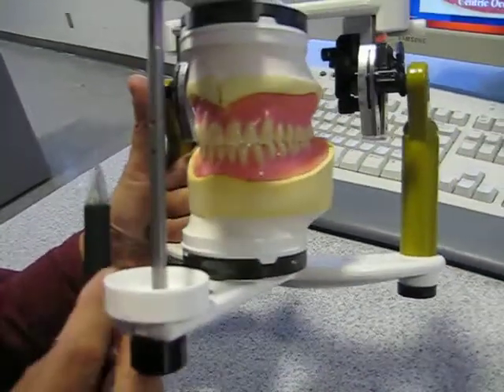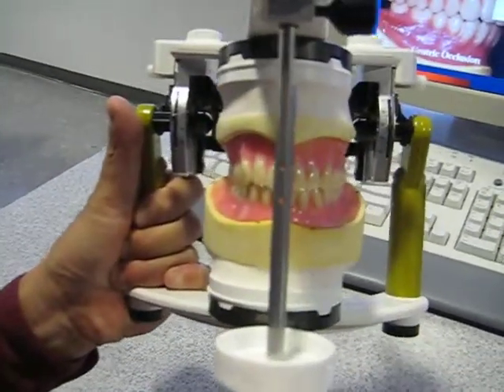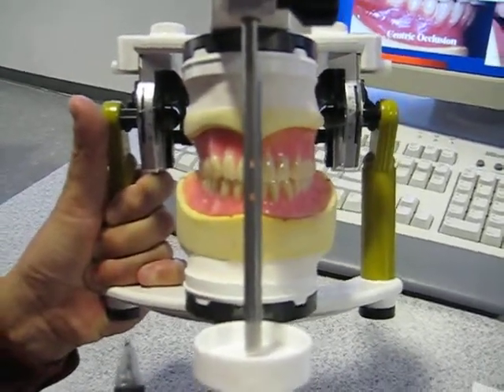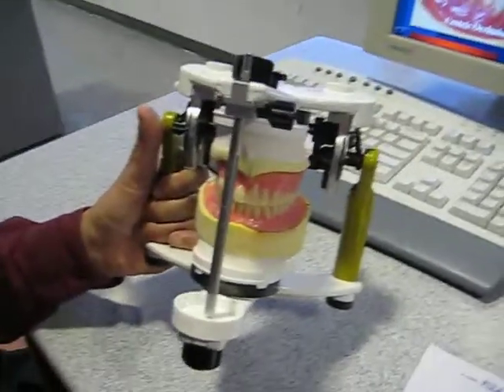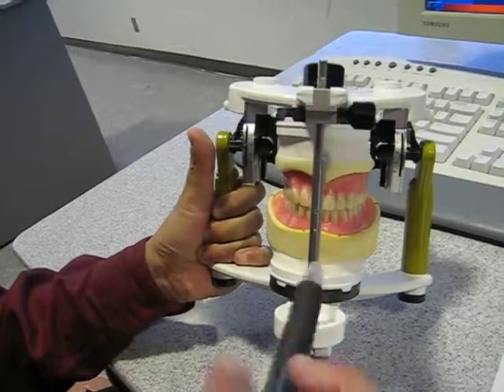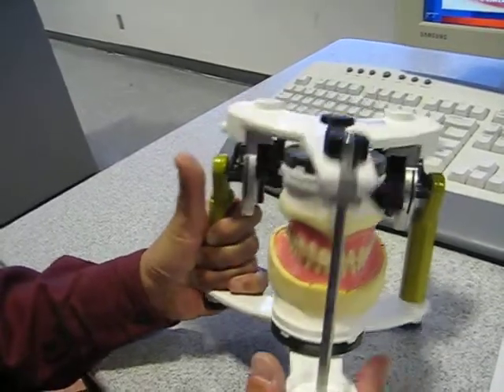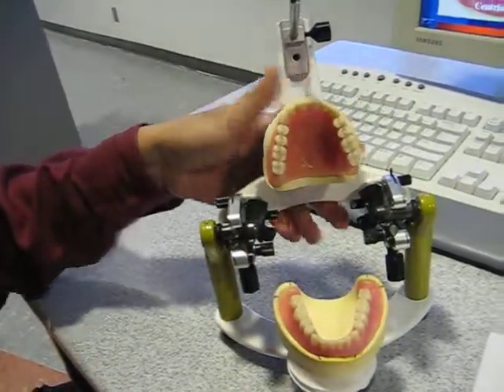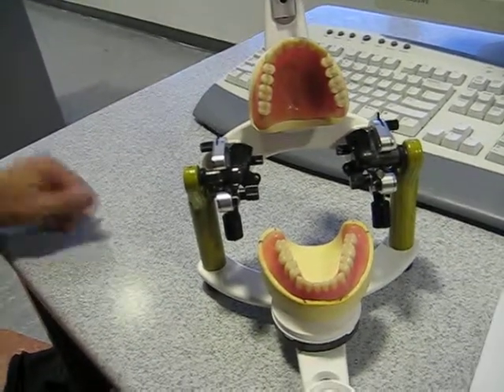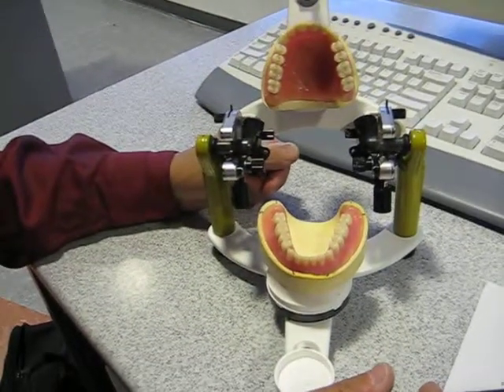Looking at it from the frontal plane, the amount of toe in, however, is pretty nice on both the maxilla, maybe a little excessive in the mandible, but within reason. So taking off points for the arch form, maybe the horizontal overlap position, we'd probably assign this about 4 points out of the 6. Okay. Now, the important thing to remember, though, is that those 2 points may have cost us some other points further down the grade sheet.